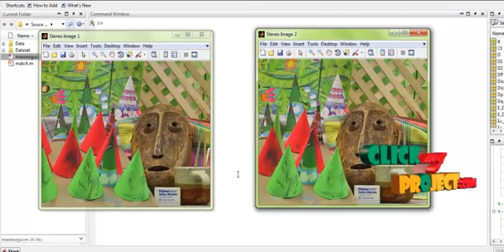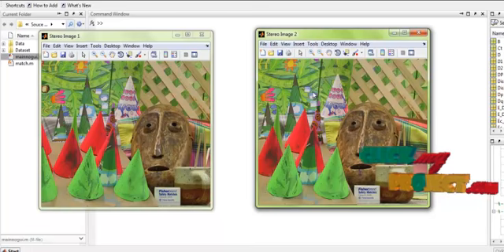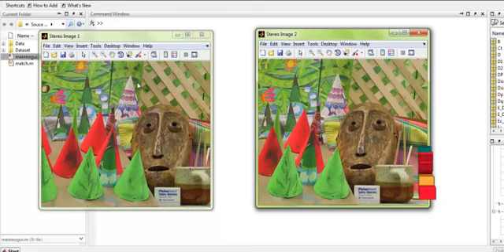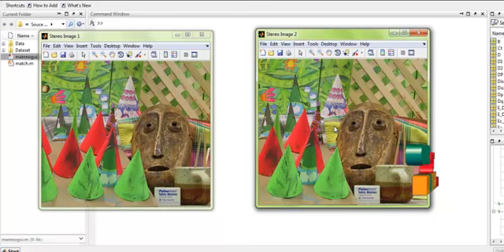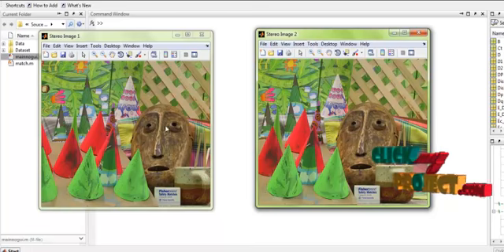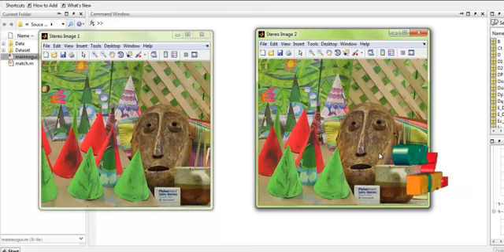These are the input images that we have selected. This is stereo image 1 and this is stereo image 2. Stereo image 1 is always considered as the reference image. Based on that, the disparity is estimated. As we can see, this image is taken from the right point of view and this image is taken from the left point of view, and hence some of the regions were missing in both of the images.